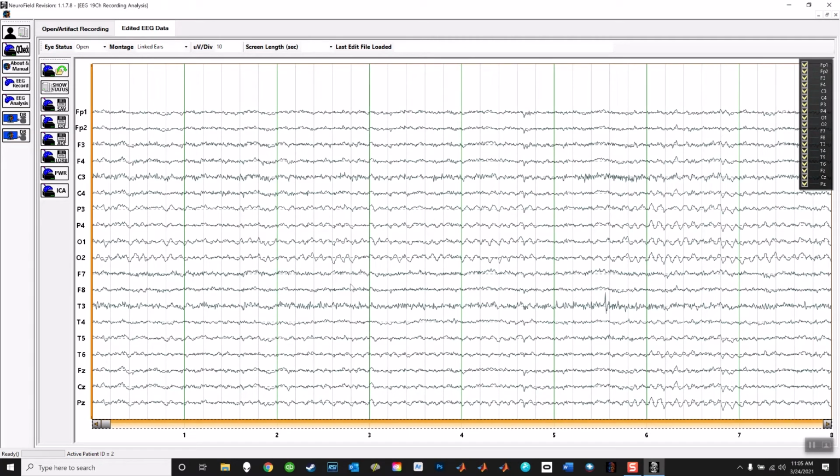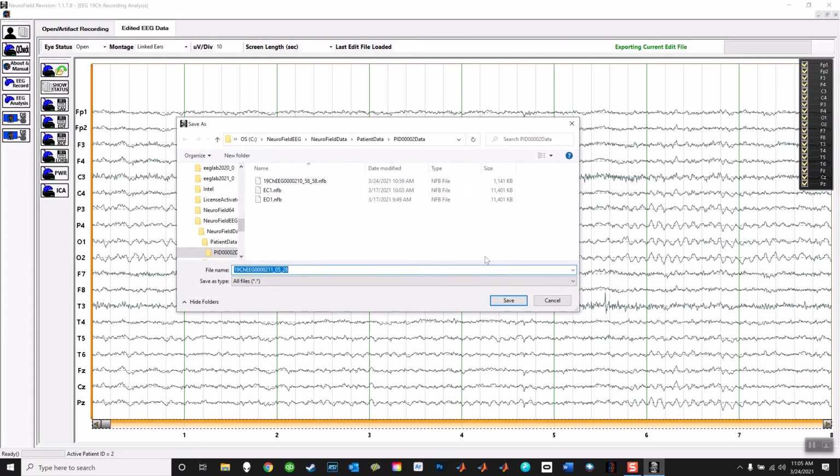Now for independent components analysis, you do want to do that. You want to grab the whole record. And once you grab it, then you want to save it as an XDF file. So you'll see one of the buttons that says XDF. These are file formats that you can save in. I'm going to click on that, store data to XDF file, and I'm going to store it.